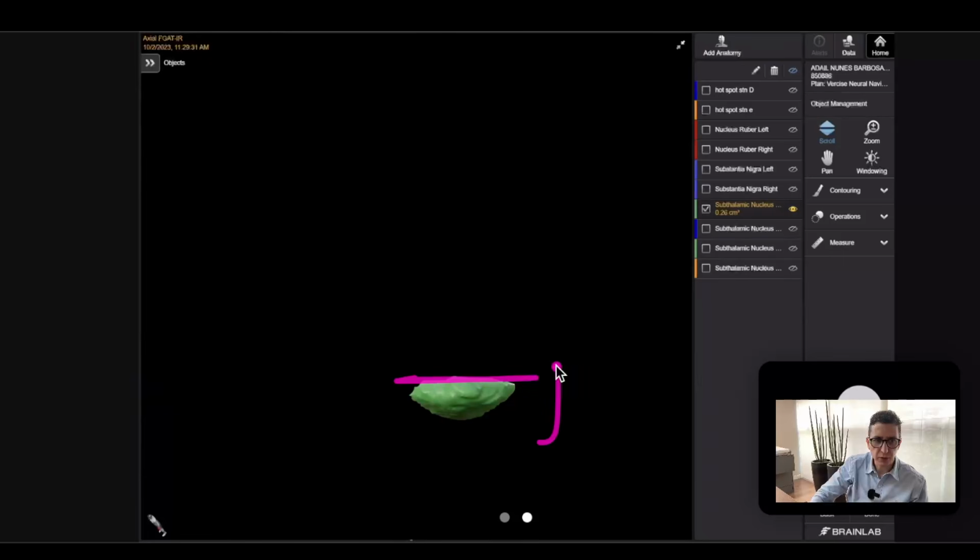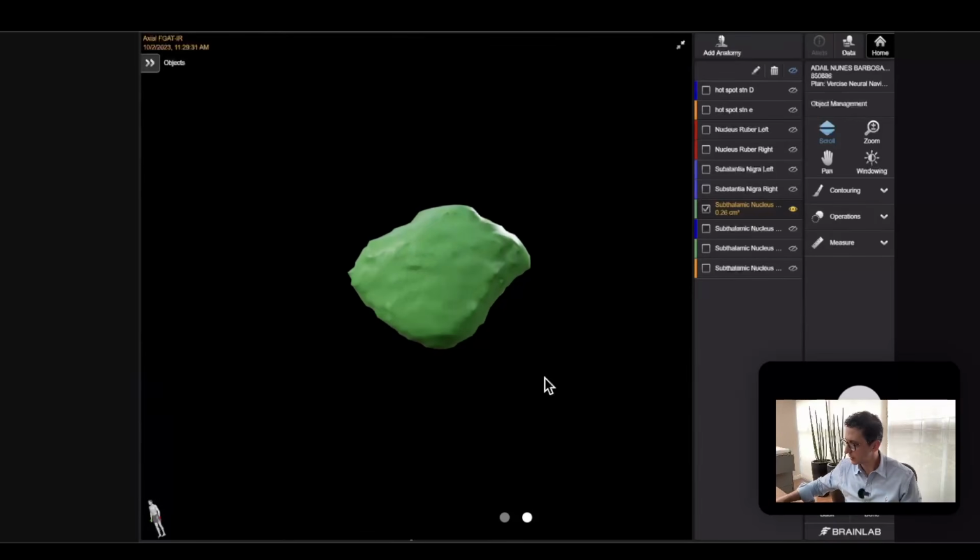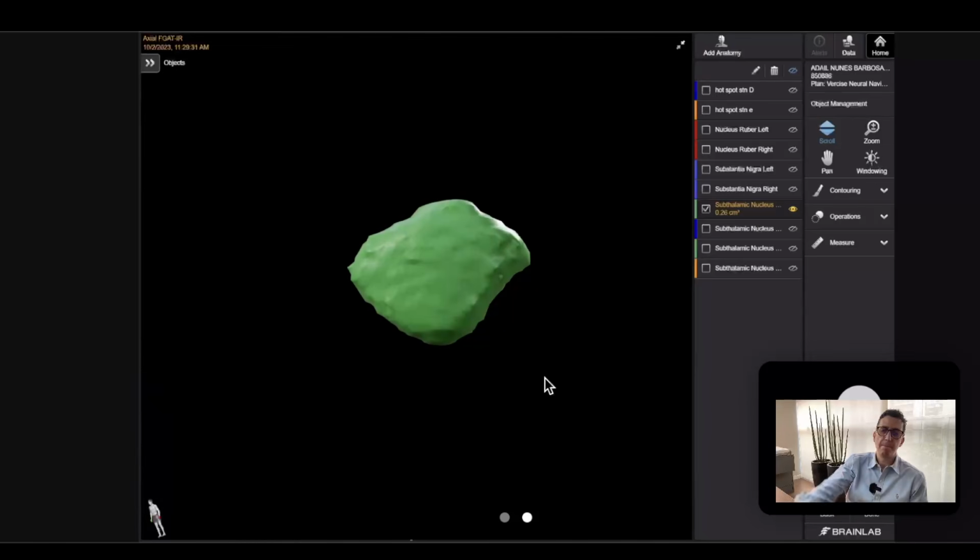And then I'm going to push with my fingers again the nucleus here. And once I do that, I prepare the nucleus to be cut. So remember, the Stimview and these elements from Boston, they draw the STN from each patient. So depending on the patient that you are preparing, the imaging of the STN will be different, okay?